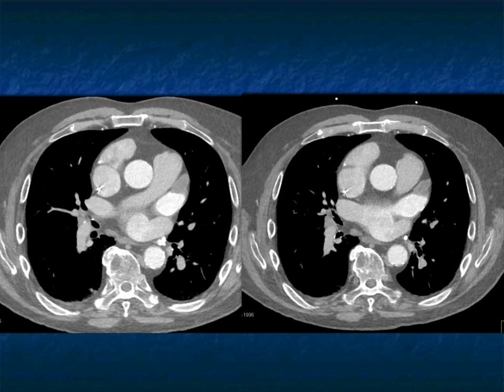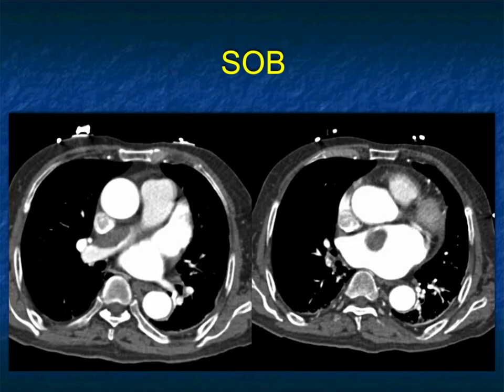If you're uncertain, simply go back and rescan the patient 30 seconds later or 60 seconds later. This will fill in. Again, these pseudoclots are most common in patients with large left atrial appendages or in patients with poor cardiac output.